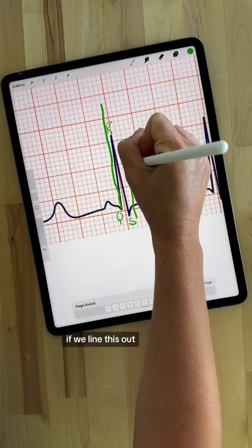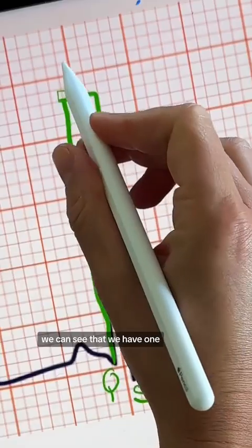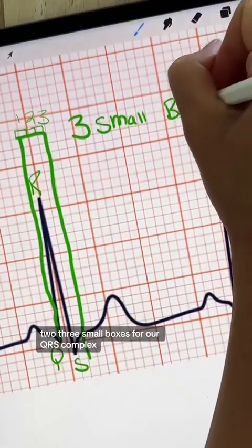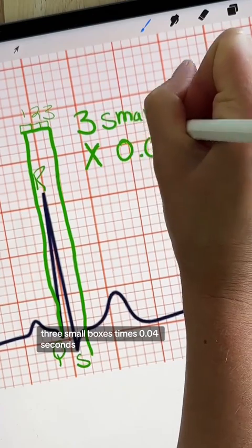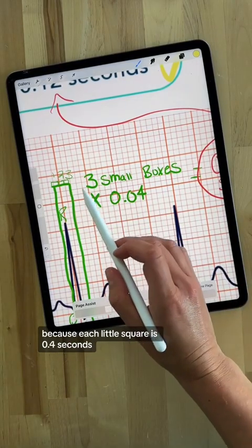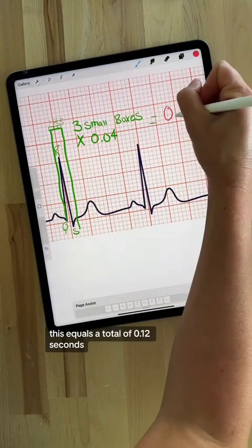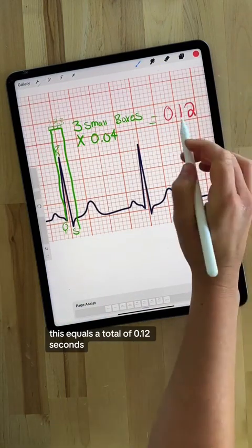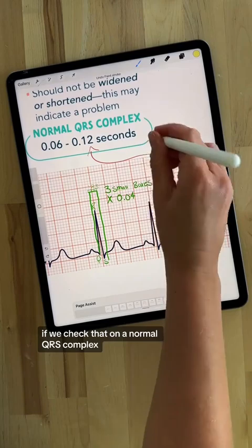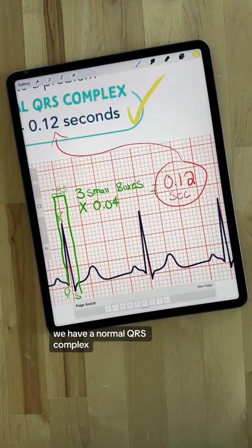If we line this out, we can see that we have 1, 2, 3 small boxes for our QRS complex. 3 small boxes times 0.04 seconds, because each little square is 0.04 seconds. This equals a total of 0.12 seconds. If we check that on a normal QRS complex, we have a normal QRS complex.